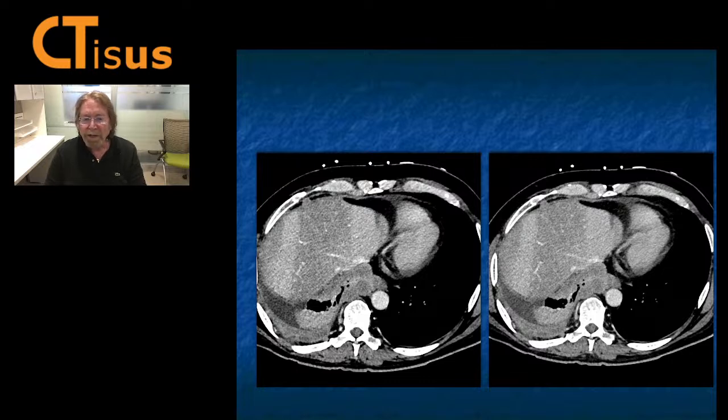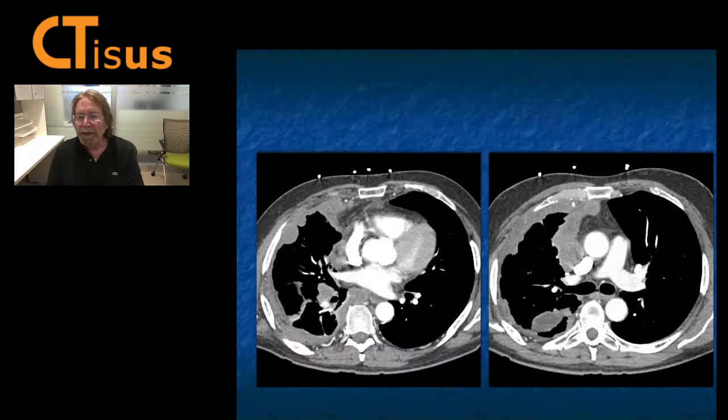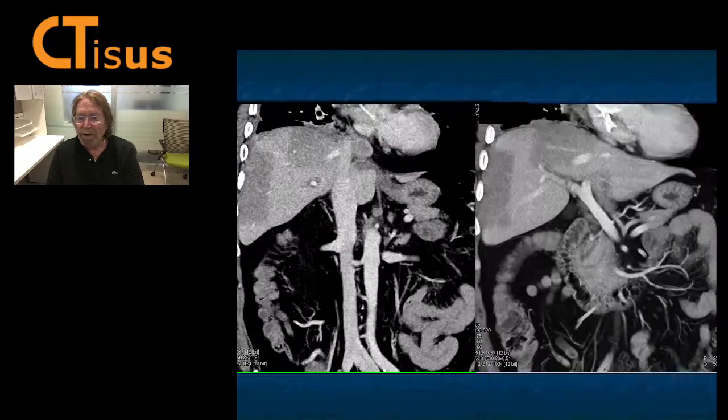And so what are we looking at here? And I'll show you another example, same patient. Look at these bands, look how sharply marginated they are. They're not just random, something was done. That's the hallmark of radiation therapy. And this patient had pleural masses, which were mesothelioma. Radiation of mesothelioma, radiation hepatitis. Just a beautiful, beautiful case. Really nicely showing you those bands. Do not make the mistake of calling that tumor or fatty liver or infarct or anything else.